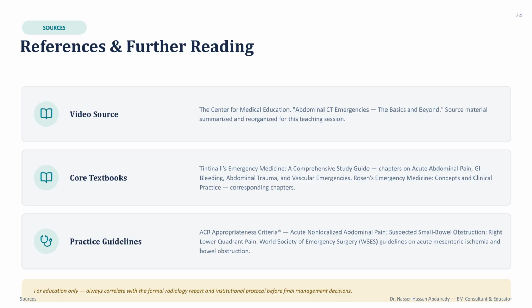Finally, identify epiploic appendigitis by the target sign, focal stranding around a hyperdense dot, which is self-limiting. Conversely, distinguish between cecal and sigmoid volvulus using the coffee bean sign to guide surgery.